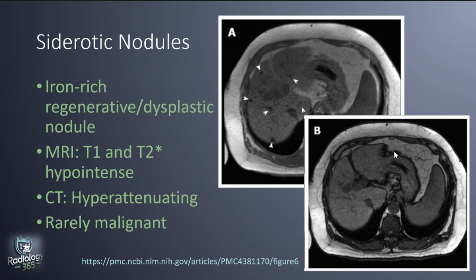We have these multiple nodules which are barely perceptible on the out of phase image and tend to drop signal on the in phase, characteristic of siderotic nodules.